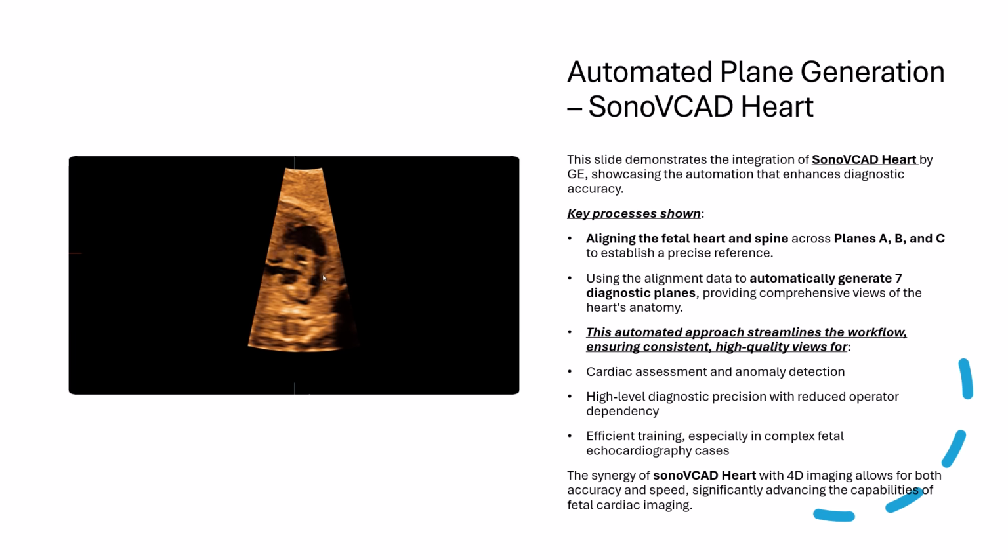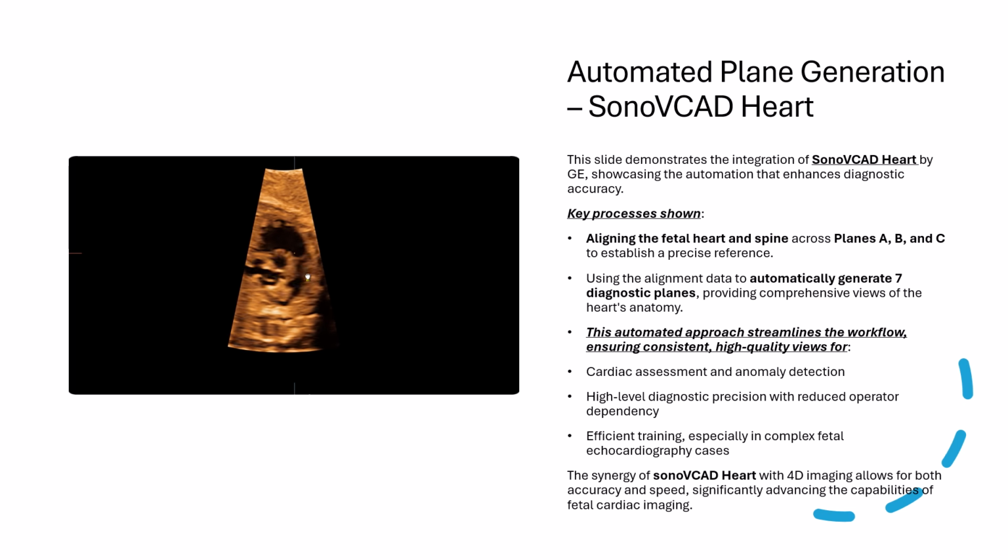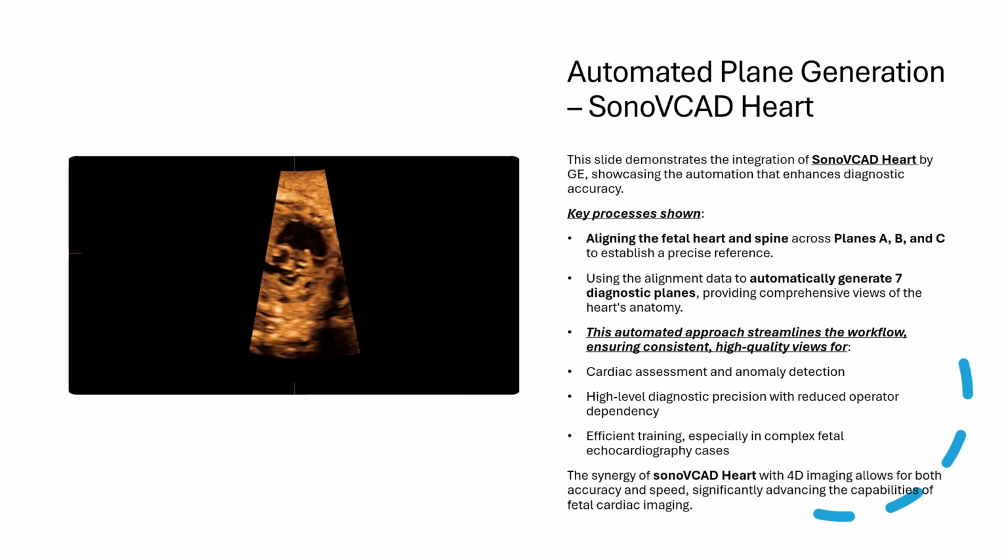When paired with high-quality STIC volumes, Sono-VCAD Heart delivers a perfect fusion of speed and accuracy, allowing clinicians to focus less on mechanics and more on meaningful interpretation.